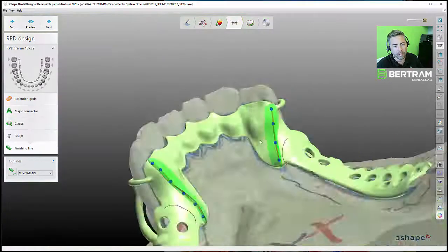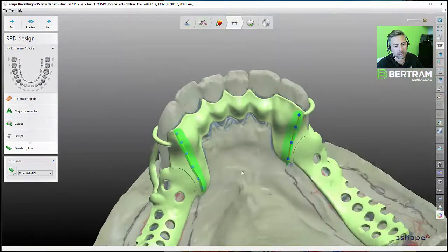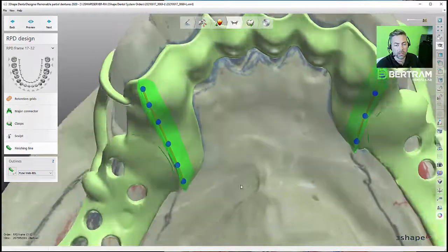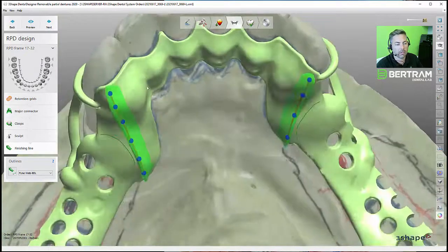But we just consistently want to do them straight when we're working on cases. It's just honestly easier for finishing. Keeps them cleaner. It's easier for supporting, for printing. So there's a lot of advantages for actual production.